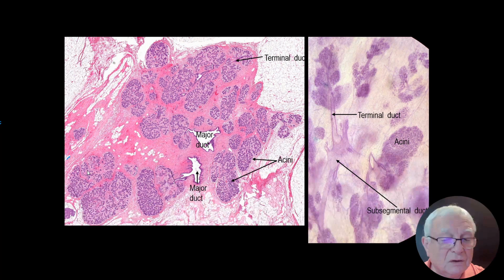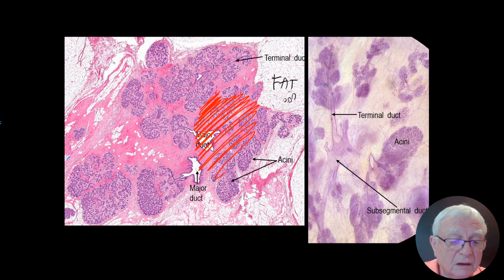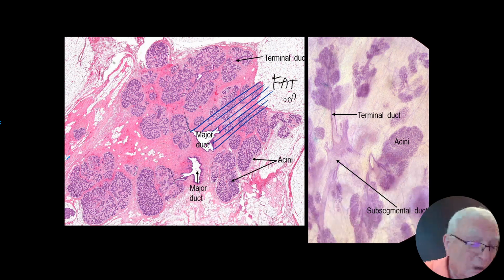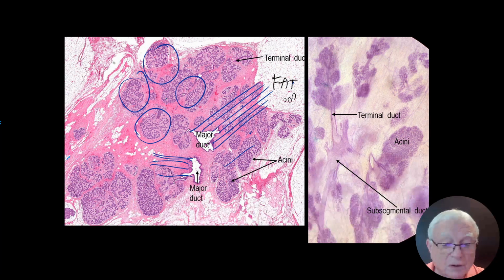So now I take you to the multi-headed microscope. You are a partner of the pathologist sitting beside you. Why? Because this is adipose tissue. Here are the fat cells. Great. And this one we very much dislike. The red is the fibrous tissue. And where is the duct? The duct cross-section is right here. Ducts normally are pleated; when they contain cancer or fluid, then the pleat's gone. But right now, here is the duct and here is another duct. 1, 2, 3, and the leaves on the tree, the milk factories, smaller, larger TDLUs.